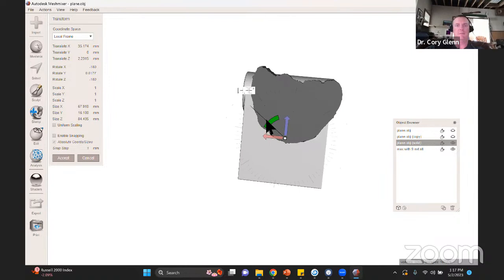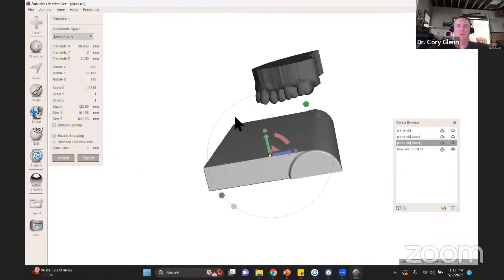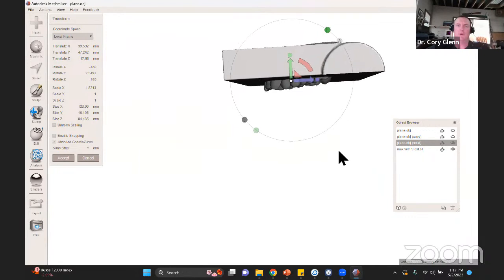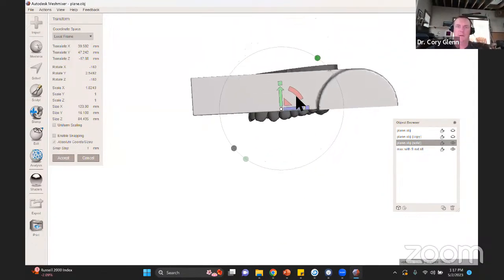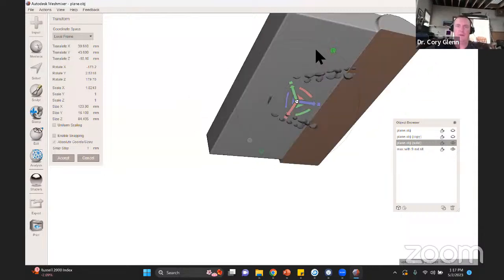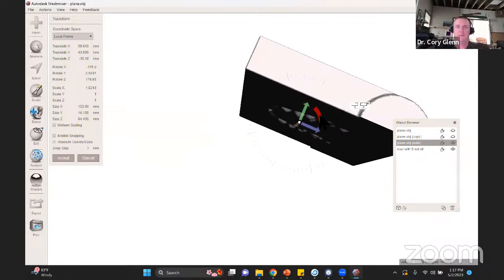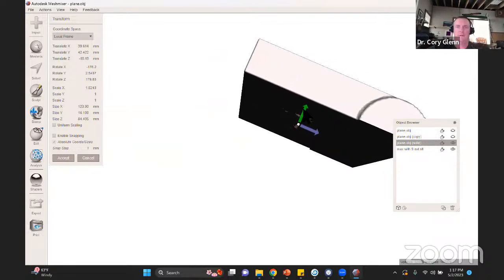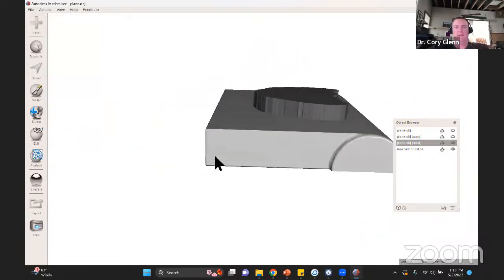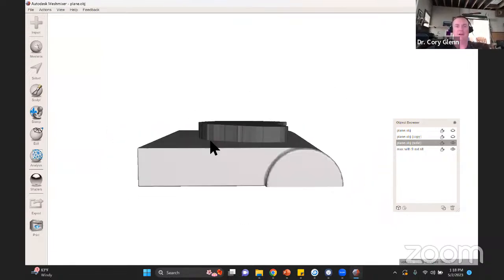You're going to line this up. And then you're going to parallel the occlusal plane. So I can just basically look at where it's shining through the bottom. All right. Get it parallel to the occlusal plane, which that's pretty close. All right. Which would mean if we had the maxilla superimposed over here, the top of this is your plane of reduction.